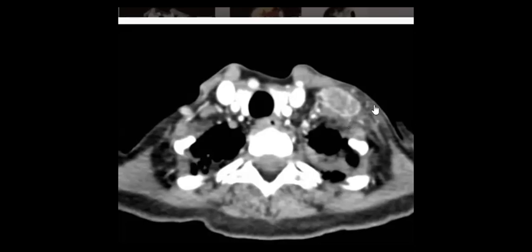So I see that maybe there is a soft tissue lesion here. Do you agree with me? Yeah, an enhancing lesion in the chest wall, maybe you can mention that it is in the upper part. Subcutaneous, maybe, and so maybe in the chest wall.